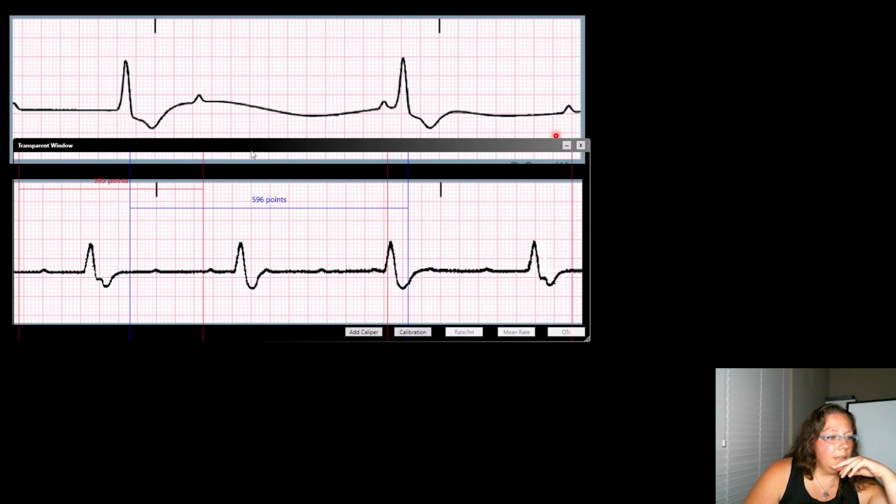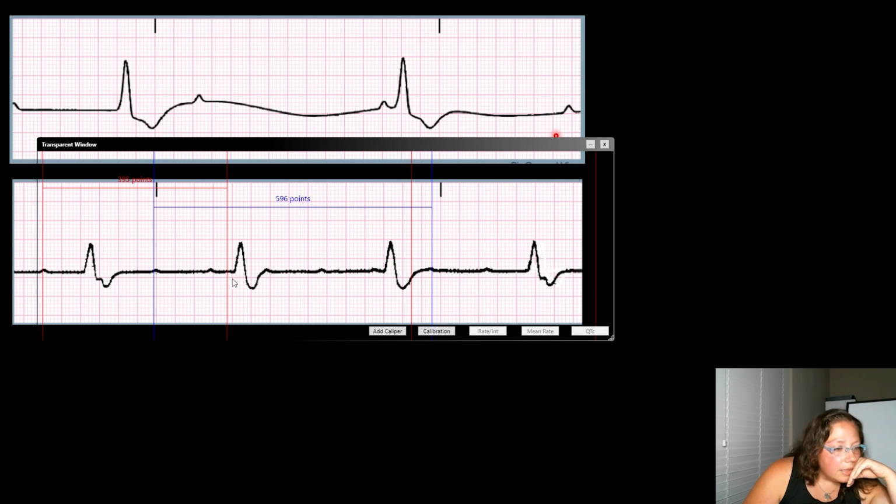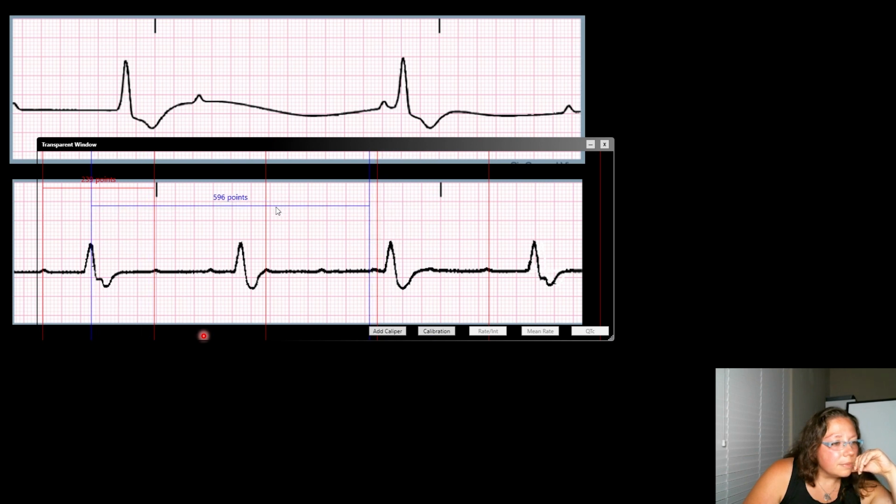Bring this down here. Okay. Let's measure this up to the P waves. And then this will march up to the QRSs. Get this over here. There. So you see P wave, P wave, P wave. Oh, this is a P wave here.